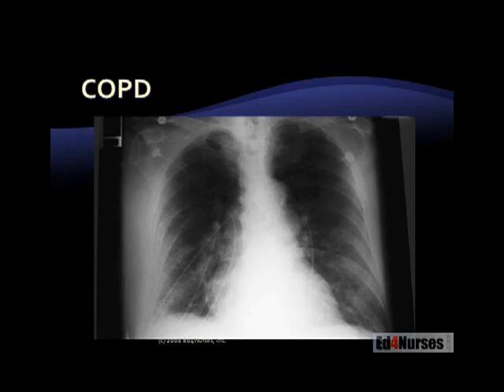Next, assess the pleura. Very dark. We were just talking about that, so darker than we would anticipate. Look for infiltrates. I'm not seeing any infiltrates here on this particular X-ray. We are going to look at some other ones that will help you to identify those. Lastly, we're going to look at the mediastinum and the abdomen. We can't really see the abdomen from this X-ray, but we can look at the mediastinum and look at how big that heart is. Doesn't that heart look kind of big? Not unusual for a patient who has COPD to also have heart failure. So we could have some heart failure going on in this patient too.